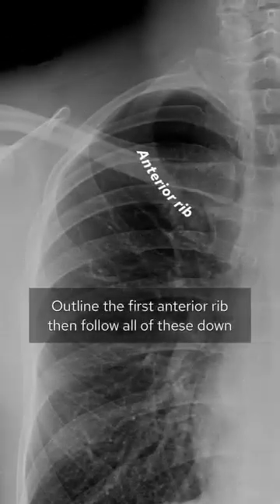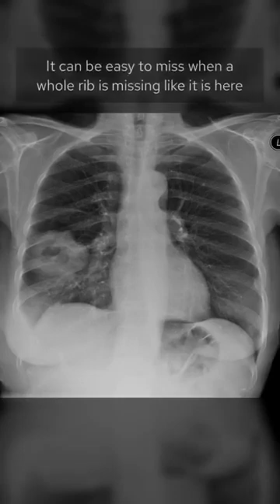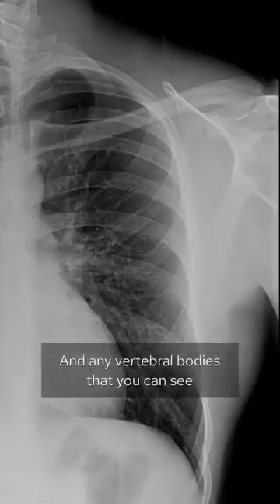Outline the first anterior rib and follow all of these down. Find the posterior rib and outline all of these. Make the image small and compare the ribs. It can be easy to miss when the whole rib is missing, like it is right here. Finish the bones by looking at the clavicle, humerus and scapula and any vertebral bodies that you can see.